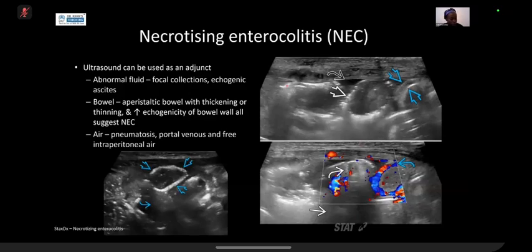If you put a color Doppler on, I don't have an image to show you, but you'll actually see little artifact of spiking on your portal venous trace, and that's because of the air bubbles going through the vein and affecting the Doppler.